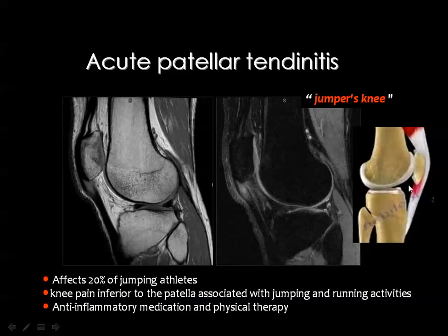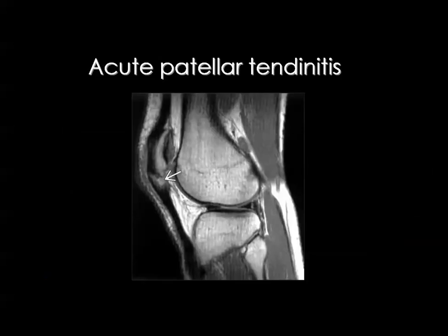And this is a diagram showing the common site of abnormal signal within the patellar tendon, indicating patellar tendonitis.